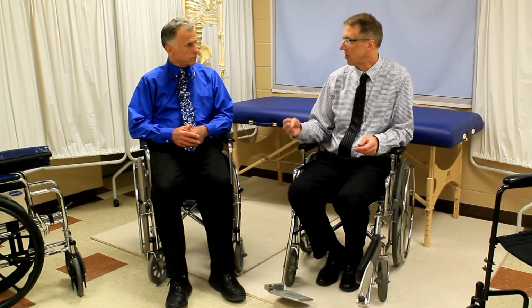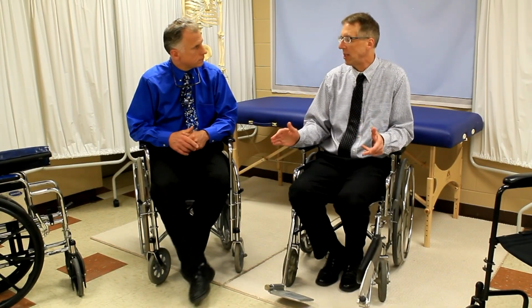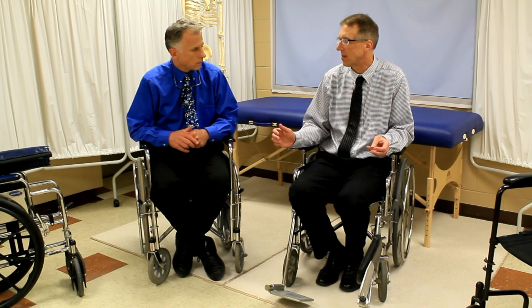Now, there are 4 types of chairs, Brad. This is a standard chair, and I'm in a standard chair. There's a lightweight chair, and these tend to be the more trendy chairs, too, I would say. A lot of the younger people have these, and they're more expensive.